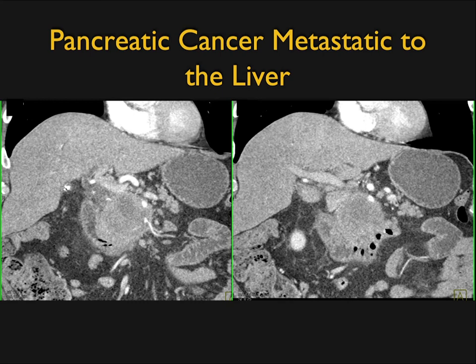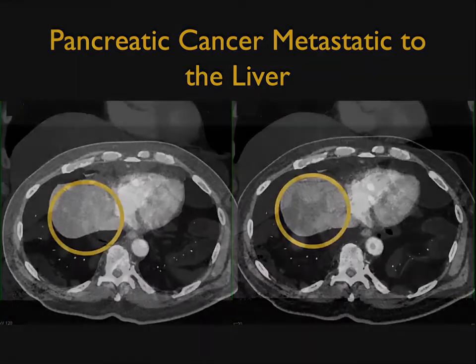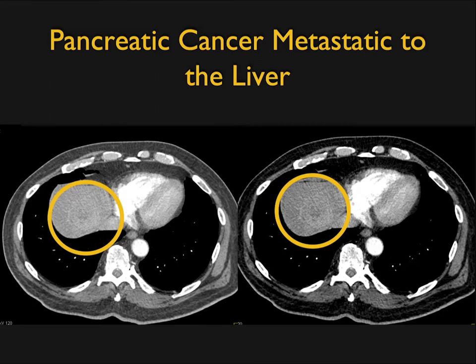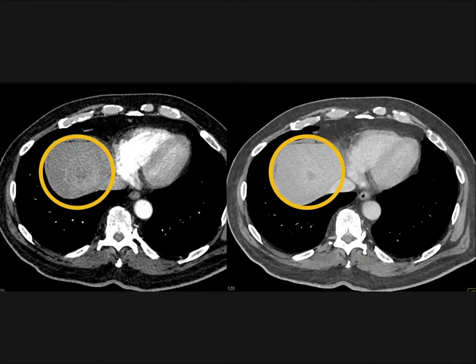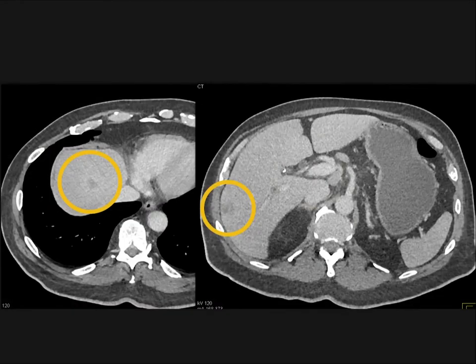I think a challenge at times is very small lesions, and reporting "cannot detect, advise clinical correlation," some craziness. Pancreatic cancer can be a challenge because we can see mets under a centimeter. I mentioned before that I like to look at the arterial phase. If it is a met, it likely has a perfusion change, so that becomes important. You can see in this case there's a lesion in the dome of the liver, nicely shown, with some perfusion changes present there. And once you go to venous phase, it's a little bit harder to see, though you do pick up additional lesions. So you need to be careful.